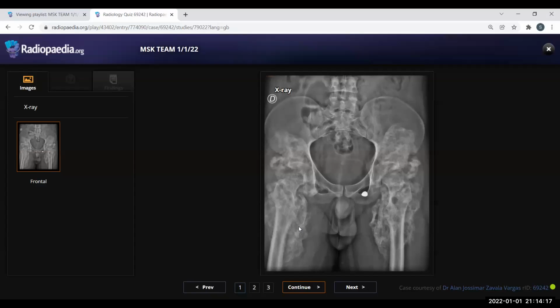And, do you see the cause of your heterotopic ossification in this X-ray? What do you think? I think there are the soft tissues. Yes, I agree with what you said. But is there anything else other than the heterotopic ossification? It could represent myositis ossificans. Excellent. But do you see the reason for this myositis ossificans here?